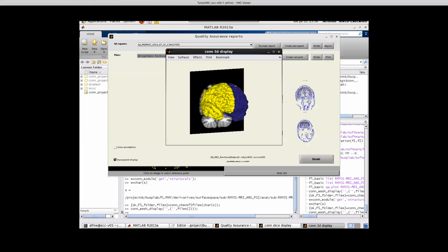For each individual subject, you have an inflated surface. Oh, right. I'm not actually saving that. You mean the LH inflated and RH inflated images? Right. I'm actually not saving those. So that's a good point. Perhaps I could actually save those, because I'm in the subset of the minimal set of files that we actually need and copy into the pipeline.